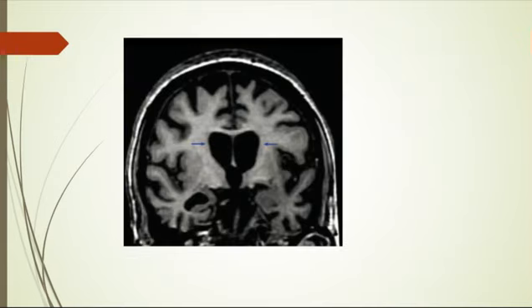What do we have here? It is, in fact, a relatively specific sign. Small head of the caudate nucleus, exactly, which indicates what disease?